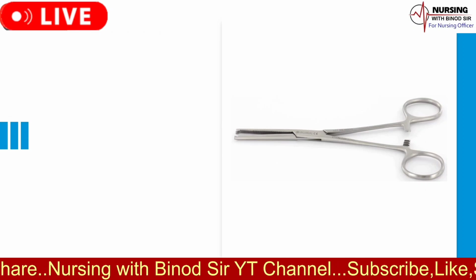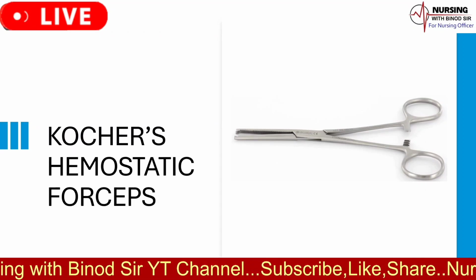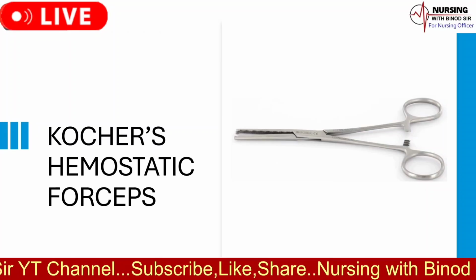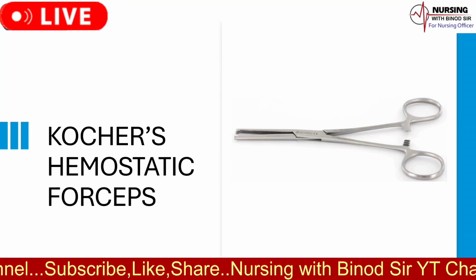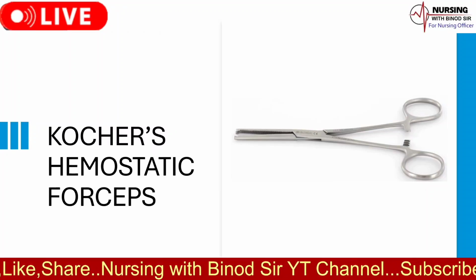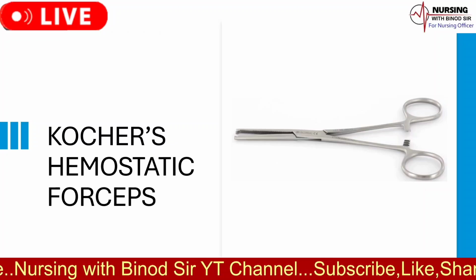The name of the instrument is Kocher's hemostatic forceps. The uses of Kocher's hemostatic forceps are as follows. 1. To clamp the umbilical cord for better grip and effective crushing effect to occlude the vessels. 2. In low rupture of the membranes as surgical induction of labor or augmentation of labor.